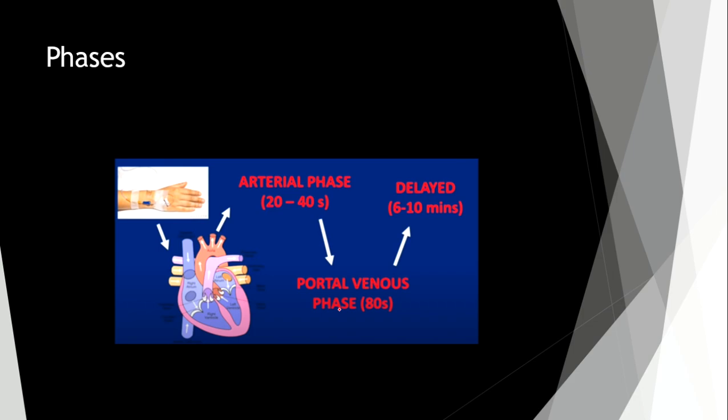So let's continue with our contrast imaging. We give our patient intravenously contrast. Then from intravenous contrast, it goes to the cava venous system.